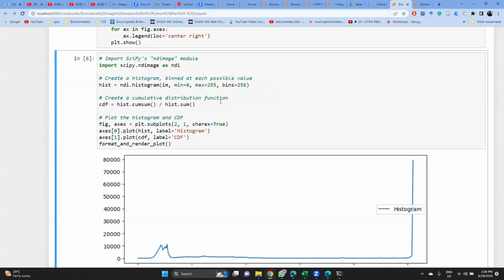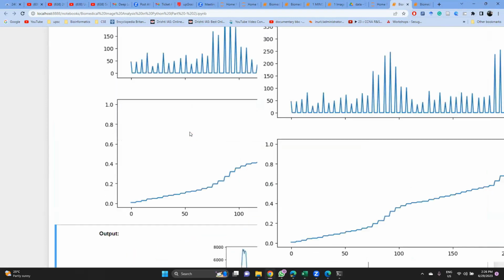Over here, we can set minimum and maximum values, just like 200, and the mean value is just like 150. It will depend on your requirement, and we can get the histograms.